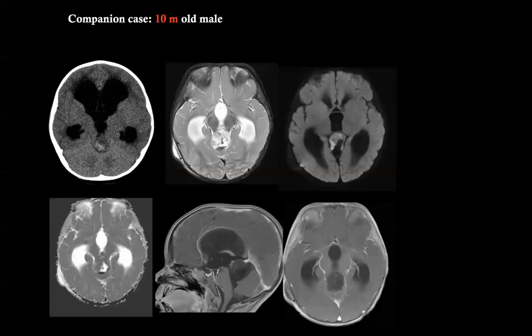Another case, so we have seen all the spectrum of germ cell tumors, some differences, and the importance of SWI. Now, look at this other case. Pineal supravermian location, so the pineal gland is involved. There is this fluid level, this is blood, striking diffusion restriction, no enhancement whatsoever. There is a bit of hyperdensity, can be blood, can be calcium, but what are the main differences from the previous one?